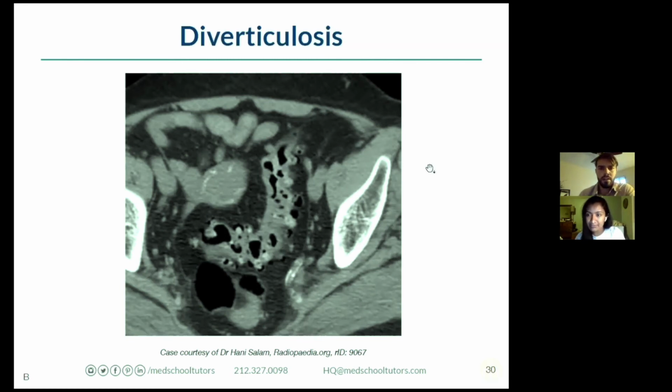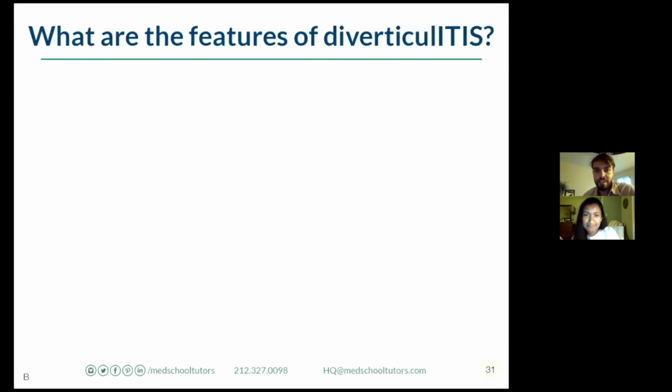So with that, yeah, Blake. So with that, I mean, diverticulosis, this is our answer. But I think there are some other potentials here. So how are we going to determine between diverticulosis and diverticulitis? That leads us into things you'd look for that aren't in the radiographic image. You can certainly find these things there sometimes, but if I was thinking about the differences between diverticulosis and diverticulitis, I would certainly be looking at my vignette and my objective findings. They'll never lead me astray.